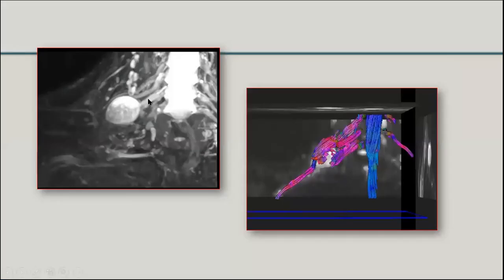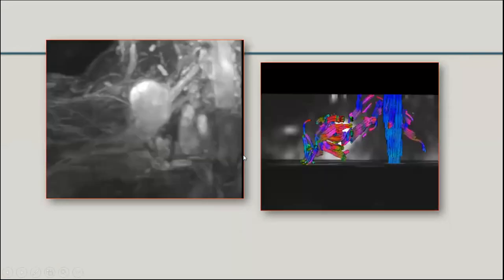Versus a tumor, most of the tumors in brachial plexus come from C5, C6. So here is a tumor coming at around C6, coming from there, and 5 is displaced on the top and 7 is enlarged. So usually in that area, the tumors come in, and here you can see partially disrupted tracts. Again, high ADC value, it's a schwannoma.